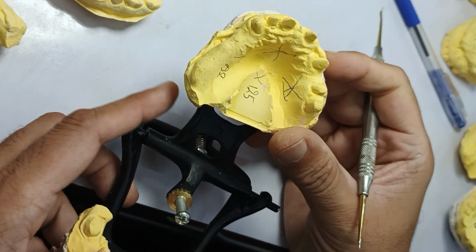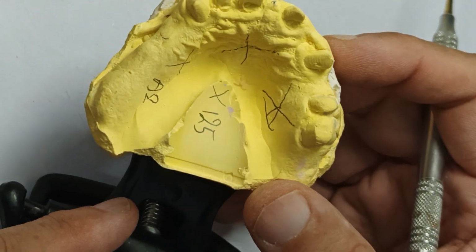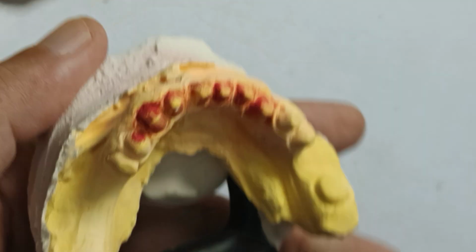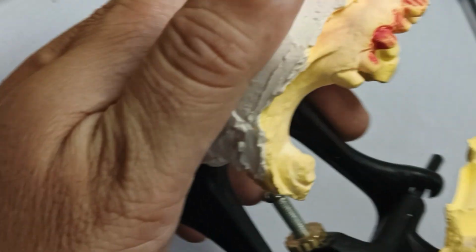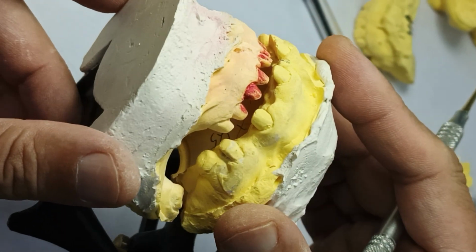Look at this. Subhanallah. Just teeth cut all around. This is a partial case. This is not a bridge case, opposing of this. So guess what? They're making a lot of money to do, mashallah, good qurbani of a cow or 2 cows, but it's all haram.